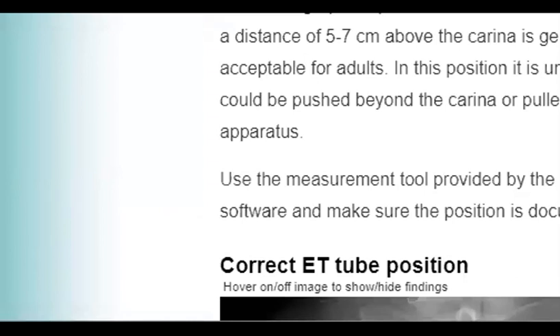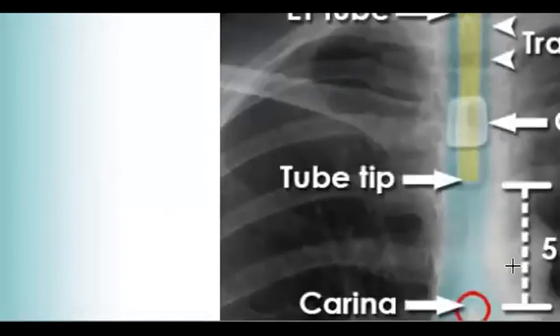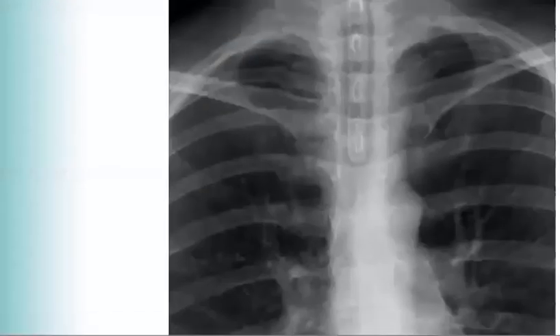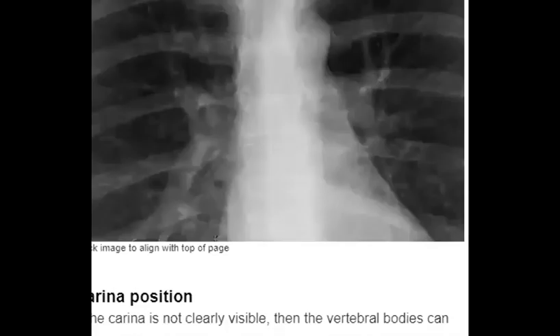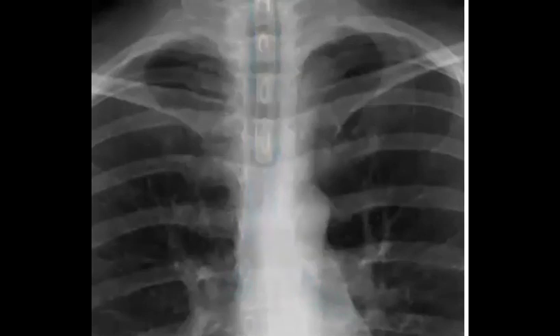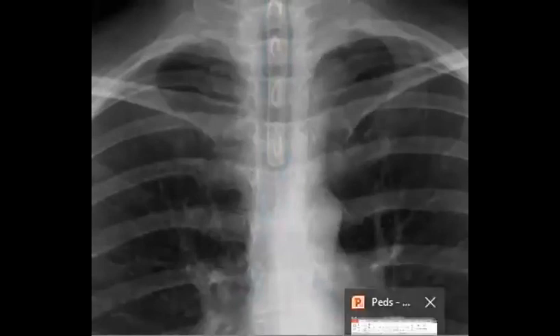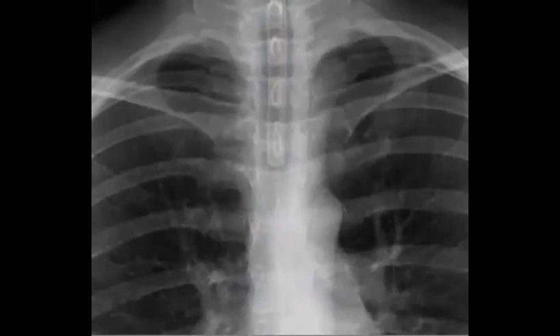So let's check here, just for a bit of confirmation about this one. What do you think of this appearance? Is this a good position or not? You already mentioned it, just to confirm that everyone has clear knowledge about this. So good position or not?